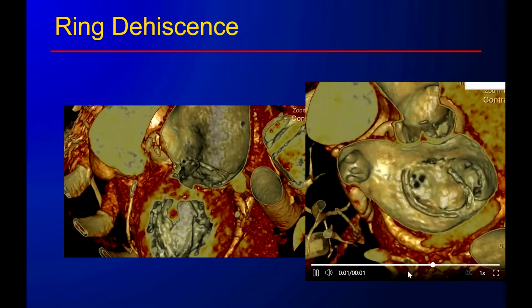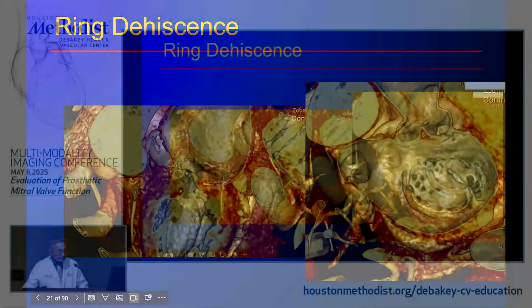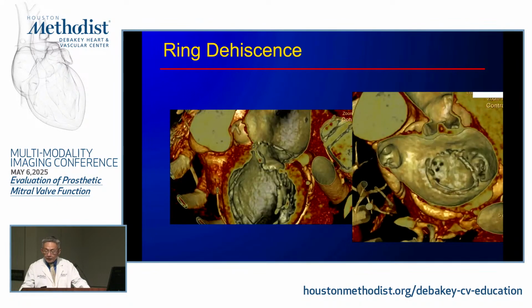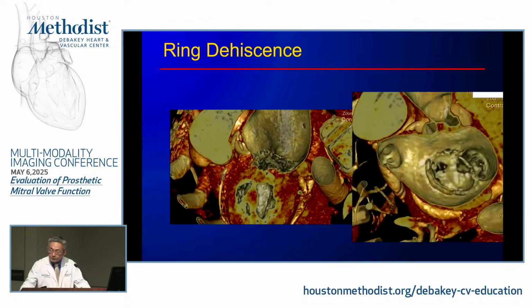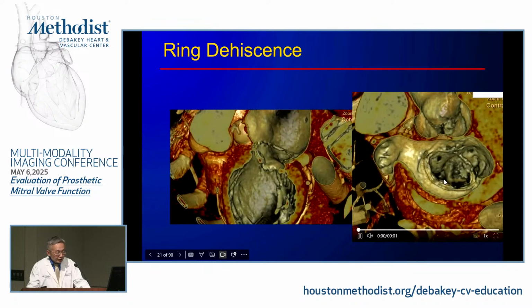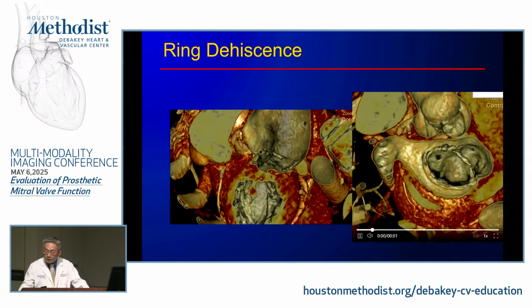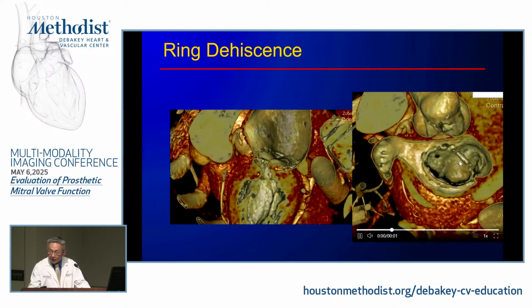Yeah, Carlos, I would like to hear. Yeah, obviously, but it depends how that gap is closed, because this is obviously not a paravalvular leak. This is a destabilization of the annulus and redilation of the annulus, malcoaptation. So you have a jet that usually straddles that ring. Some is going behind it, some is going within the ring. So the original MR is still in the valve. Yeah, so there is restoration, if you will, of the native MR again, because now the annulus has dilated. So plugging this hole doesn't help.